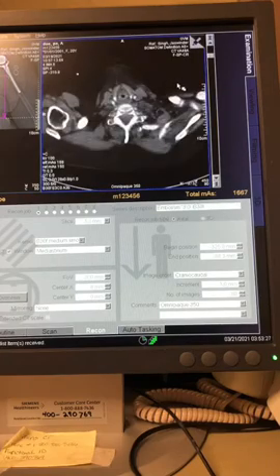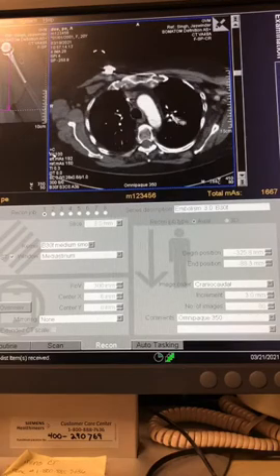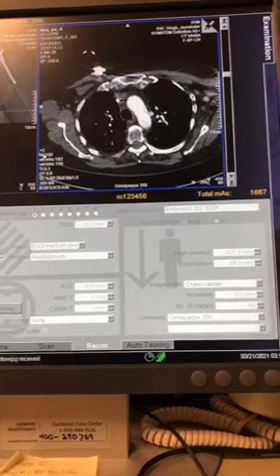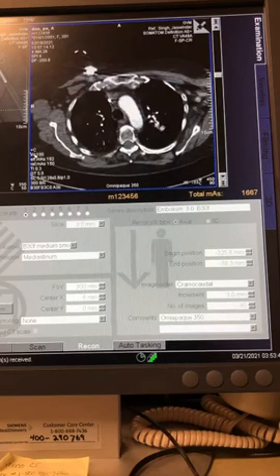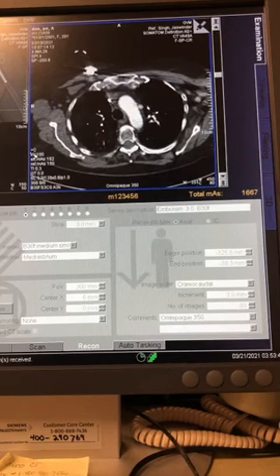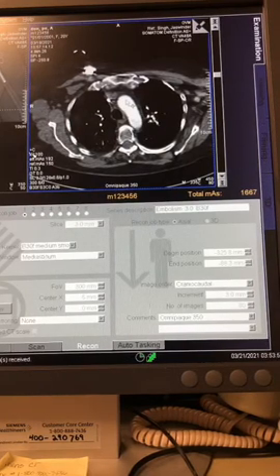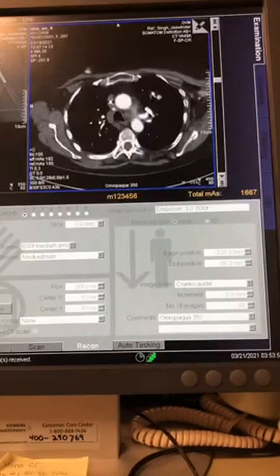So it's gonna look a lot like your regular chest that we just did. But notice the difference. On the chest, the vessels were not like the arterial vessels. This is our aortic arch here. It is bright white. It's as white as bone, right? So we're in the arterial phase, whereas the chest is not in an arterial phase, not so much. It's kind of between arterial and the portal venous. It's still pretty early, but it's not arterial anymore.